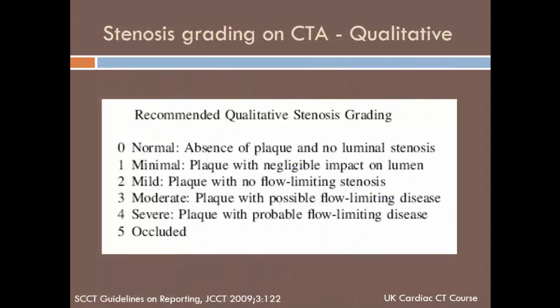The way one classifies different degrees of stenosis on CT angiography can be both qualitative or quantitative. In qualitative grading, we can say it's normal, minimal, mild, moderate, severe, which we all do in routine practice.